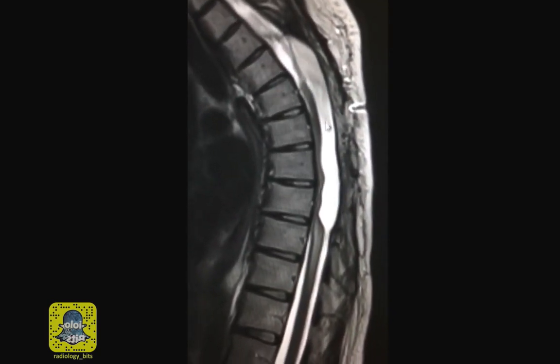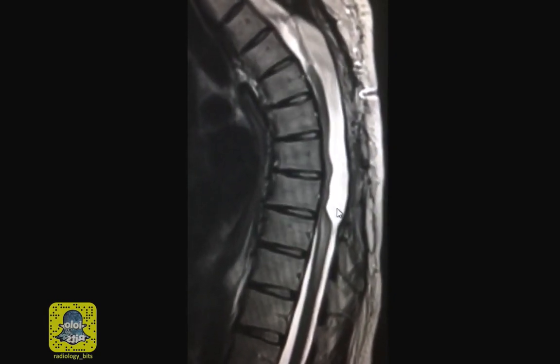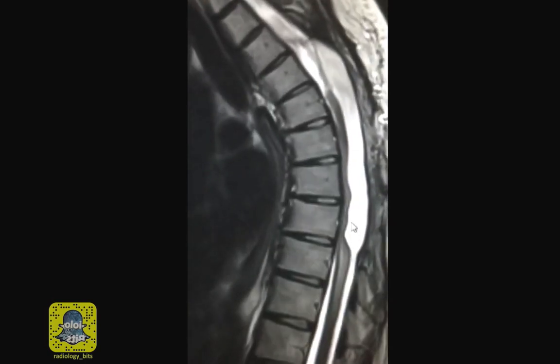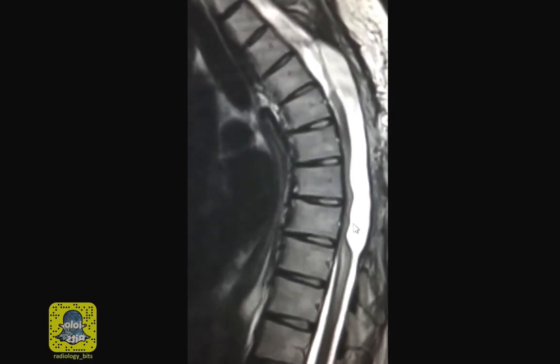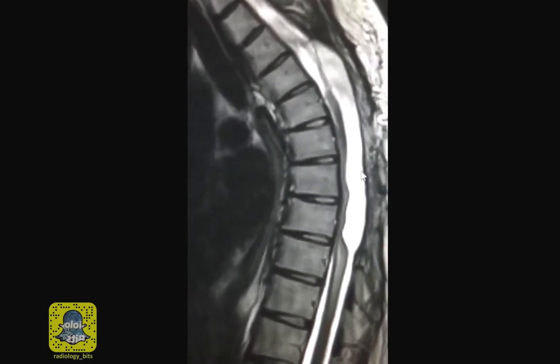Really, the main differential diagnosis would be an arachnoid cyst or an arachnoid web. Although many times it is difficult, we talked about a few ways where you could differentiate those entities from each other. Finally, by looking at all the sequences pre and post contrast, make sure that this is not something else such as hematoma, empyema, or a soft tissue lesion.